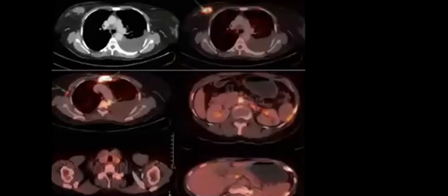If you go to the rest of the images, clearly you will find, as you mentioned, Hiba, that there is a sternal lesion. You will suspect that it could also be lymph node metastasis here and here, and even in the abdominal region. So there are many lesions that could be depicted in the PET-CT more easily than in the conventional image. That's the term of the hybrid image that should arise in your mind when you make the interpretation of the appearance.